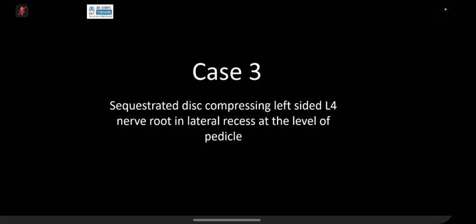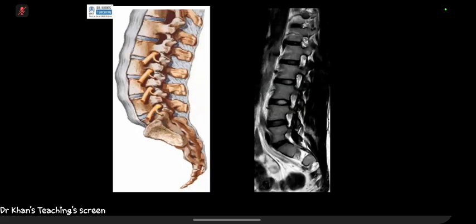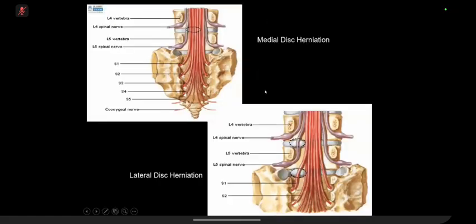So I just want to go through a bit more about the fine touch of disc lesions. Now, please remember that in your protocol, it is key when the examiners will usually give you a sagittal, and one of the things is that you have to see the keyhole. So this is how it is. And the candidate did very well, mentioned the keyholes and immediately picked up the findings. So that was very well done.